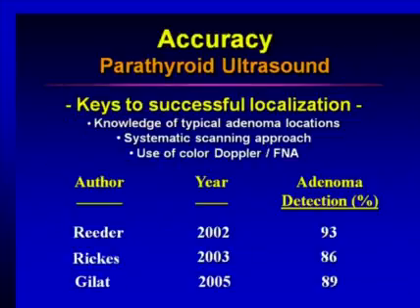And if one uses these techniques we've talked about, a knowledge of the typical adenoma locations, a systematic scanning approach of the normal and the ectopic locations, and also using color Doppler and even fine needle aspiration as needed, then adenoma detection can be quite high using ultrasound.